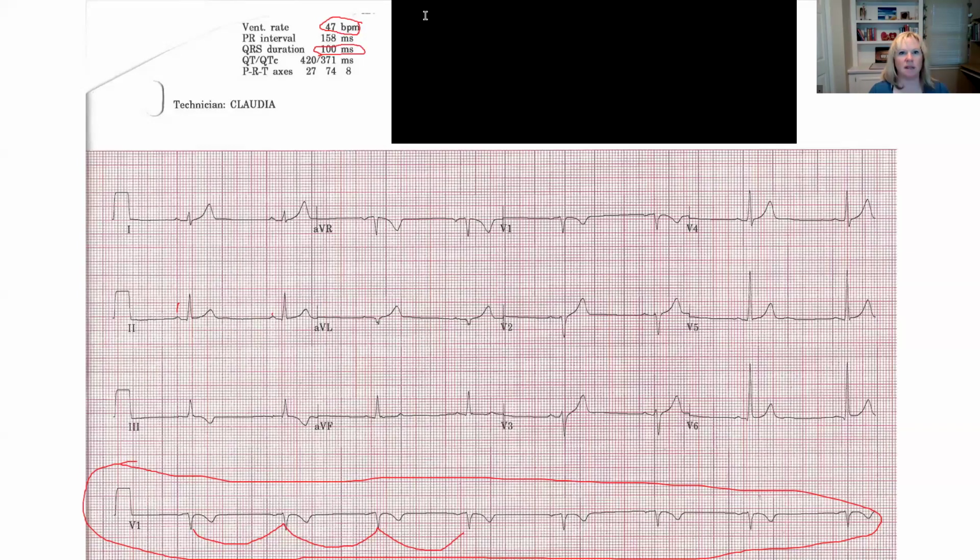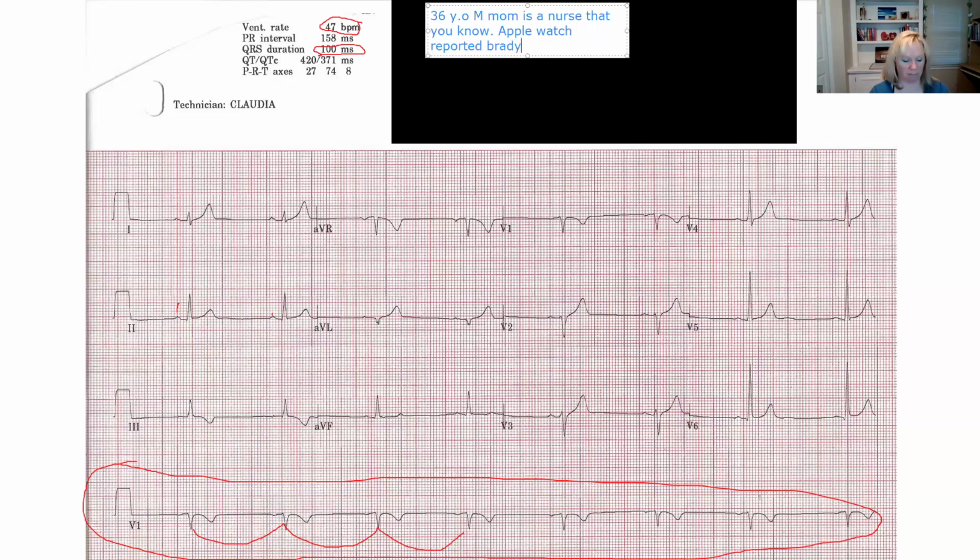I want to talk about it. So let me go over here. Now, this was an actual case. This was a 36-year-old male, and his mom is a nurse, so no pressure to get it right. And his Apple Watch reported bradycardia. This is the EKG today.